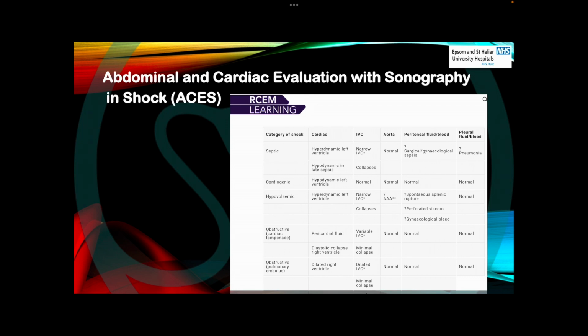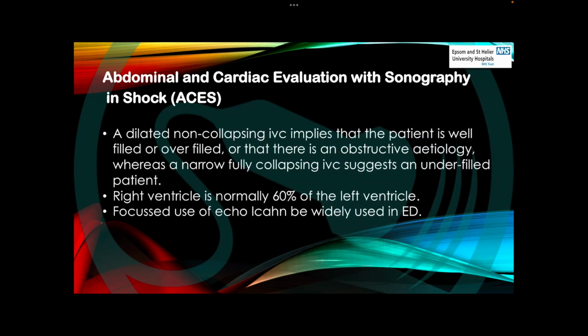Keep in mind that a dilated non-collapsing inferior vena cava implies that the patient is well filled or overfilled, or that there is an obstructive etiology, whereas a narrow, fully collapsing inferior vena cava suggests an underfilled patient.